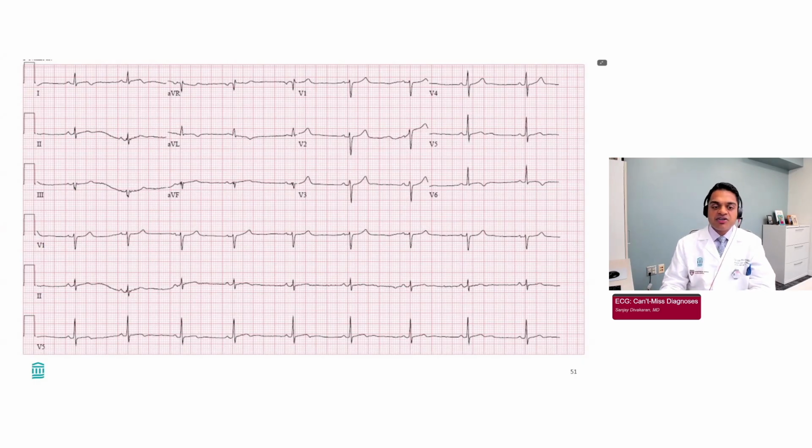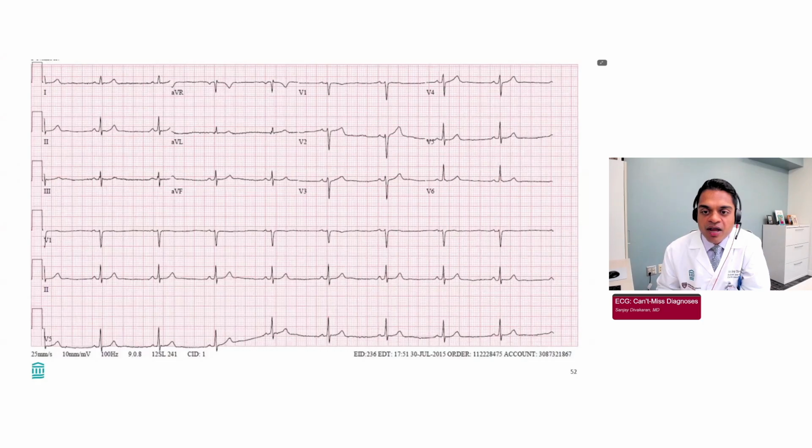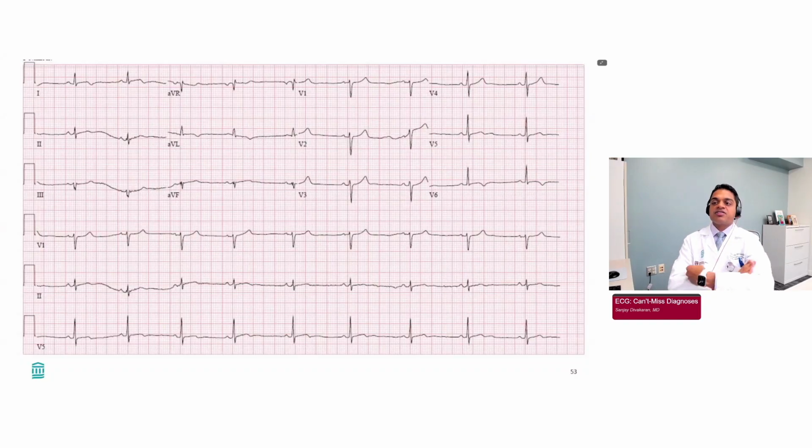So this is the patient's current ECG, and I actually have the patient's prior ECG here. So this is from an ECG a few years prior as comparison, and I'm going to put up the current ECG again.